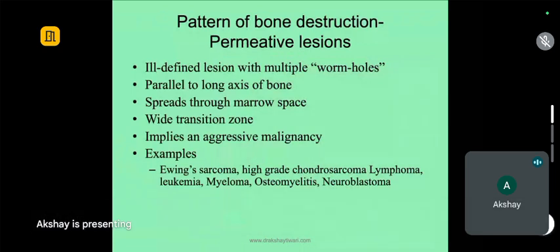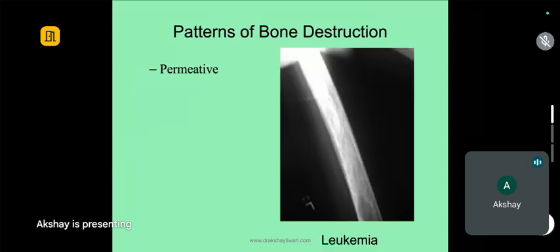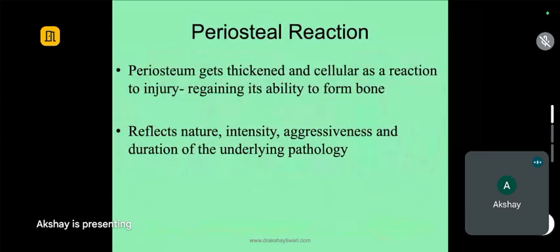Then you look at periosteal reaction. If you follow a pattern, you started from the middle of the bone and are moving outward, or some people go from outside to inside; you can develop your own method of describing an X-ray, right? So now after the cortex, what remains is periosteal reaction. Periosteal reaction will happen in response to any periosteal injury.